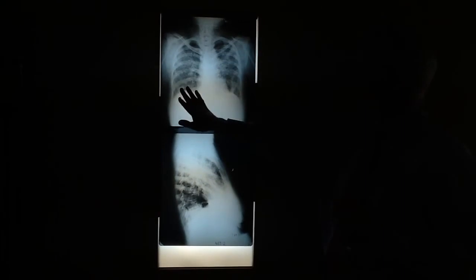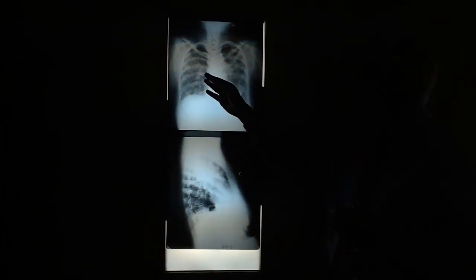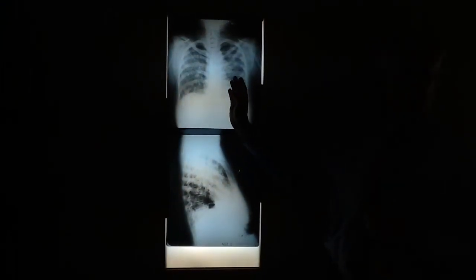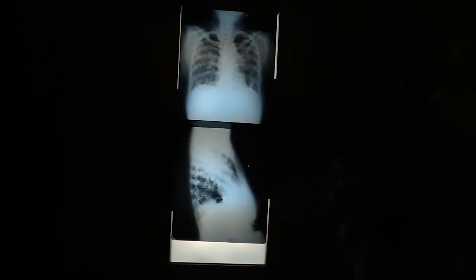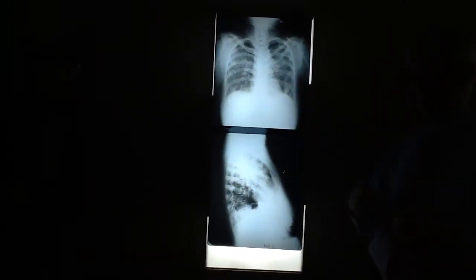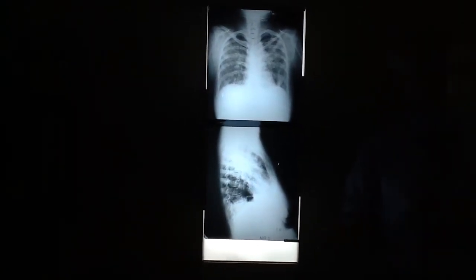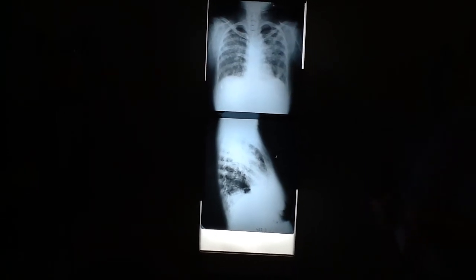The problem with this patient is they've got about a 20-25% chance of ending up with widespread honeycombing. Because about 20-25% of sarcoid patients end up scarring the lung. They end up scarred. And when they scar, they can get cicatricial scarring, like this one, or they can get honeycomb fibrosis all over. This patient could get it all over both lungs.